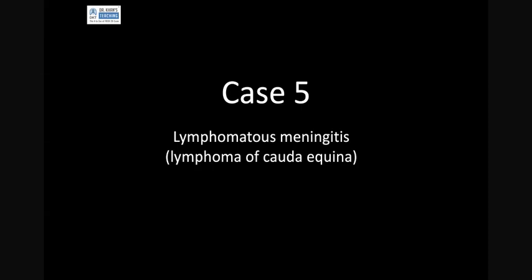Nobody is expecting you to say that, but this will be in the differential diagnosis. Please remember that lymphoma can present with an intradural lesion, intradural extramedullary, or intramedullary lesion, intradural extramedullary, and extradural.